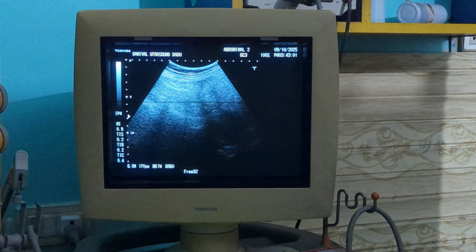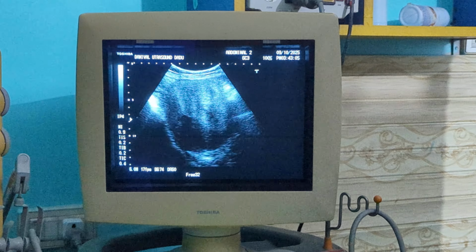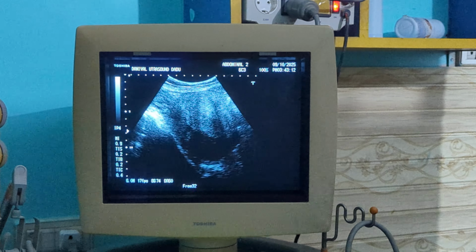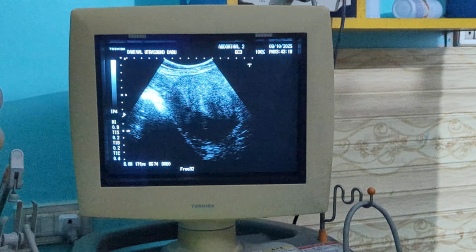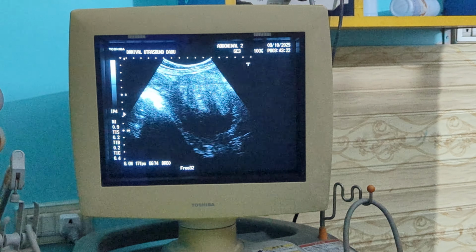Now let's go to the differential diagnosis of this mass. This is a very important thing to understand and note. The possible DD is a dermoid or mature cystic teratoma, most likely, as I told you, showing echogenic areas with shadowings. Could it be fat, hair, or calcified elements?